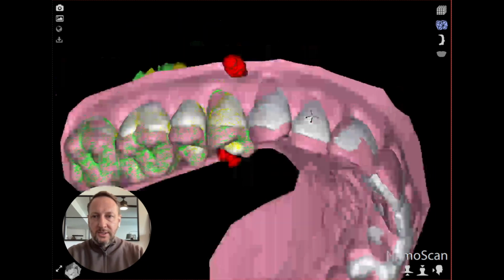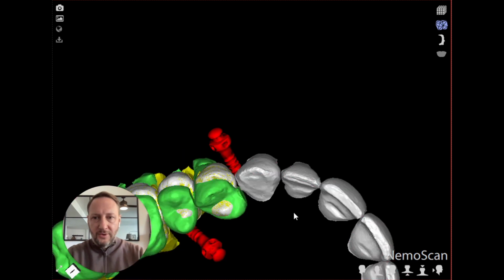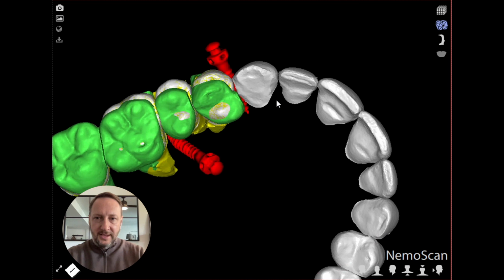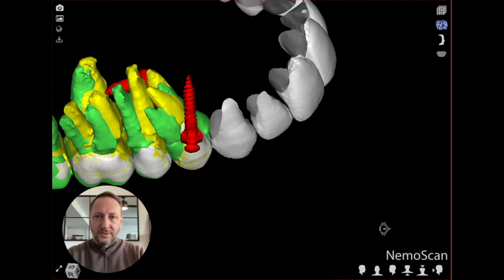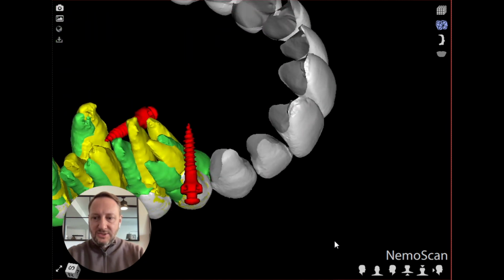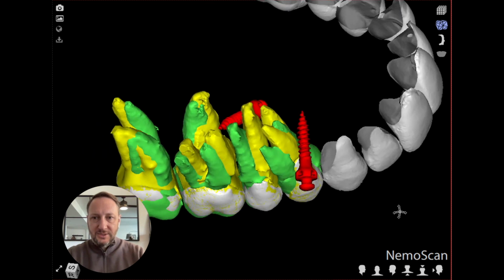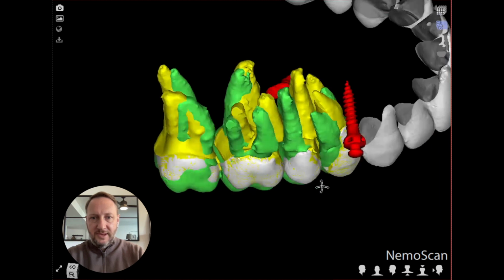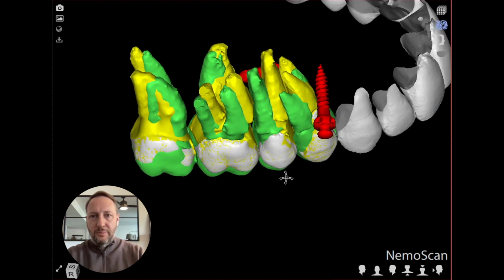And looking here in the occlusal view, let me remove the model for a while. We can start checking all the details, and the position where we're going to insert, I'm going to move here, so we can see that it is not contacting any roots. Let's check here for a while. Look, not contacting initial and final, and here in a safe position in the mesial of the premolar.